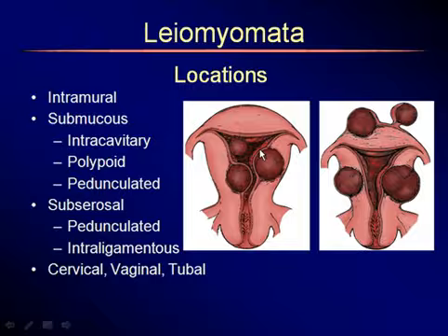If you describe a fibroid such as this one that has less than 50% submucosal component, but only has a very thin couple millimeter covering of myometrium, they will think twice about removing this hysteroscopically because the rate of perforation here would be quite high. They may want to use ultrasound during the procedure or may attempt another therapy.